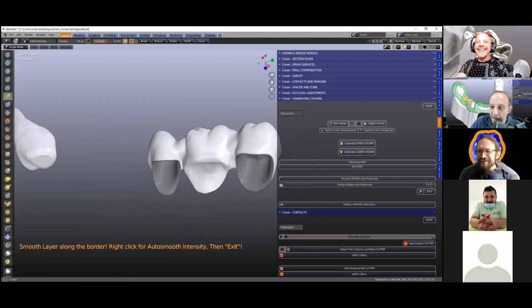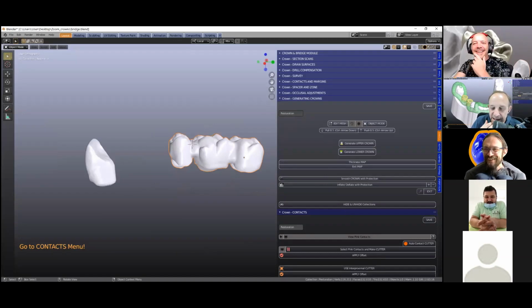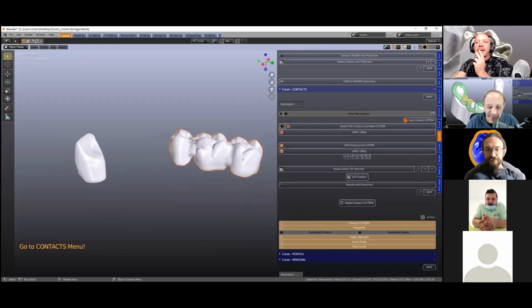Of course I have a final nice idea, but I will wait for 1 second. But don't try and fit it on your printed model. It won't fit. No, it won't fit. But yeah, you can use it as a cut to cut the model also. Yeah. No, I think this is really good.